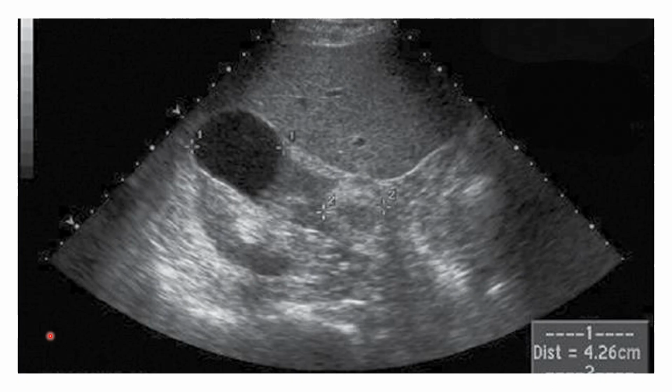Now in this slide, we have a kidney right here. It's a little hard to see. It's a transverse kidney, and we actually have two masses. We have a cyst up here with what could be internal debris, but I expect that this is probably because it's an older image and the resolution's not great on it. But in addition to the simple cyst, over here we have a solid mass that is renal cell carcinoma.